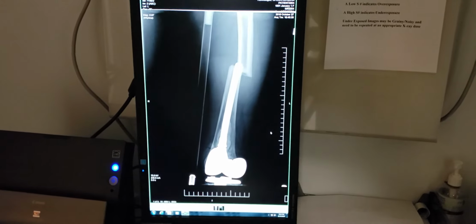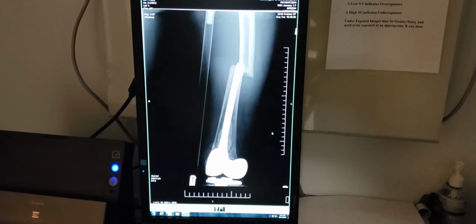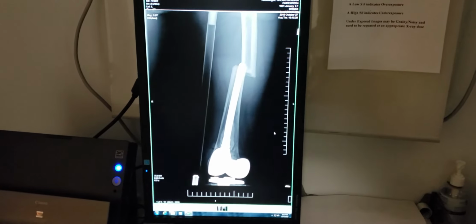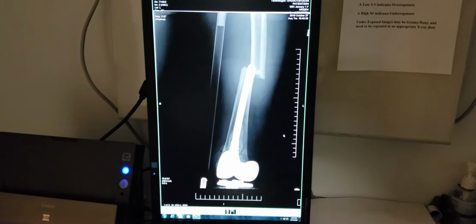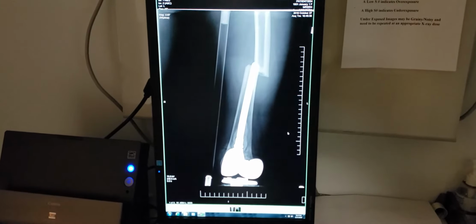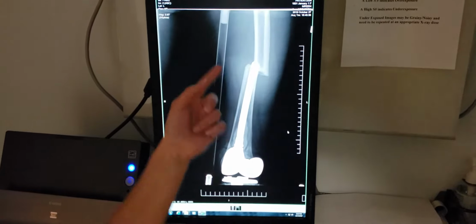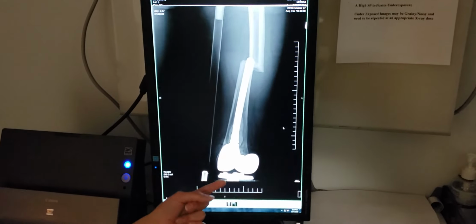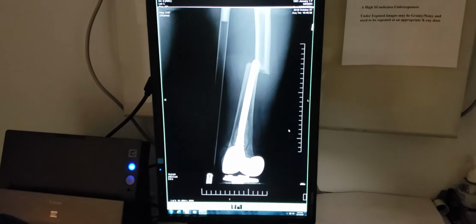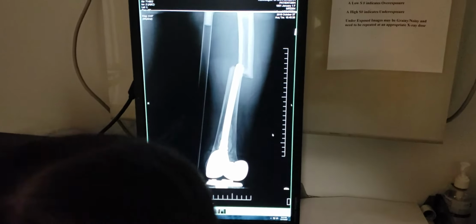Is the radiograph showing proper density and contrast? I said yes, because you can see the different shades of gray, many shades of gray. Also, the image was in the range and in the green. There is no motion in the image, and I don't think there would be because the immobilizer is supposed to keep the patient from moving their leg, so there shouldn't be motion because the patient shouldn't be moving their leg.